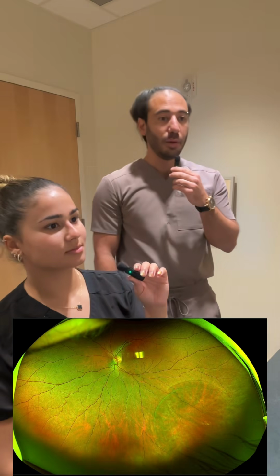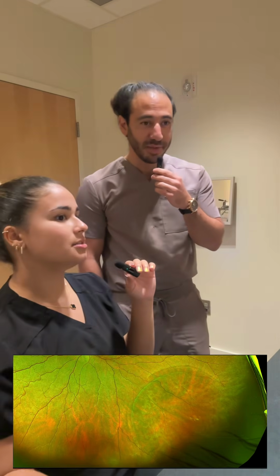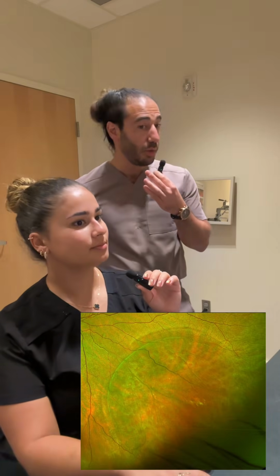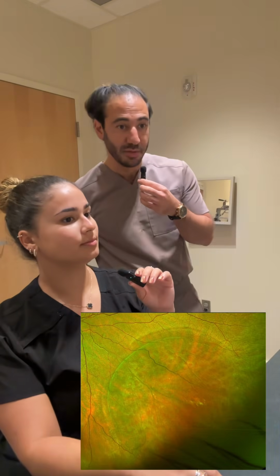What can you tell me about this lesion? You can tell that it's elevated. How do you know it's elevated? Because the vessels are darker. Okay, so on optos, that means it's elevated. What else? It's inferior temporal. All right. You can tell that there's no breaks. Okay, so no visible tears or breaks.